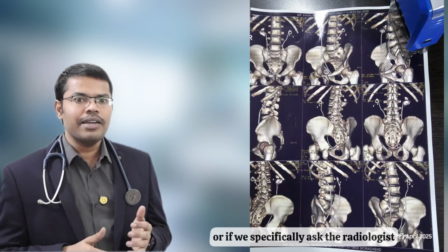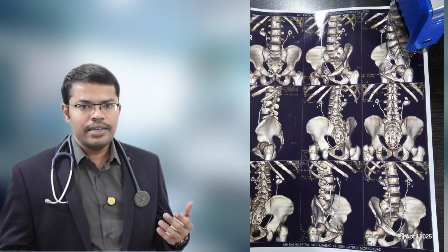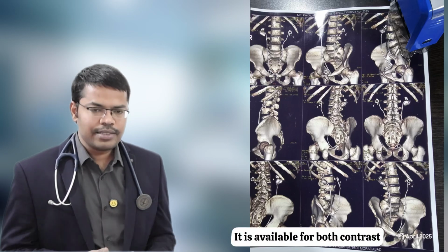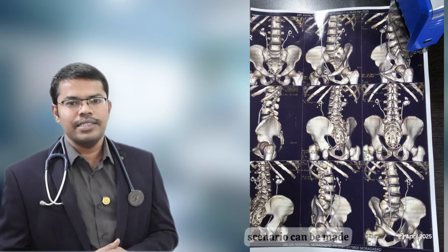Few centers, or if we specifically ask the radiologist to give these images, they will give. It is available for both contrast and non-contrast CTs, where a better appreciation of the clinical scenario can be made.